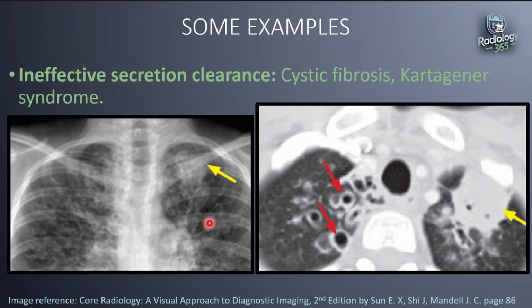So in these images, we actually have bronchiectasis from cystic fibrosis with superimposed pneumonia. The radiograph shows upper lobe bronchiectasis. We can see all these bronchiectatic areas, these hyperlucent areas within this upper and mid zone here. We can see some here as well. And then there's also this area of opacity in the apex of the left lung.